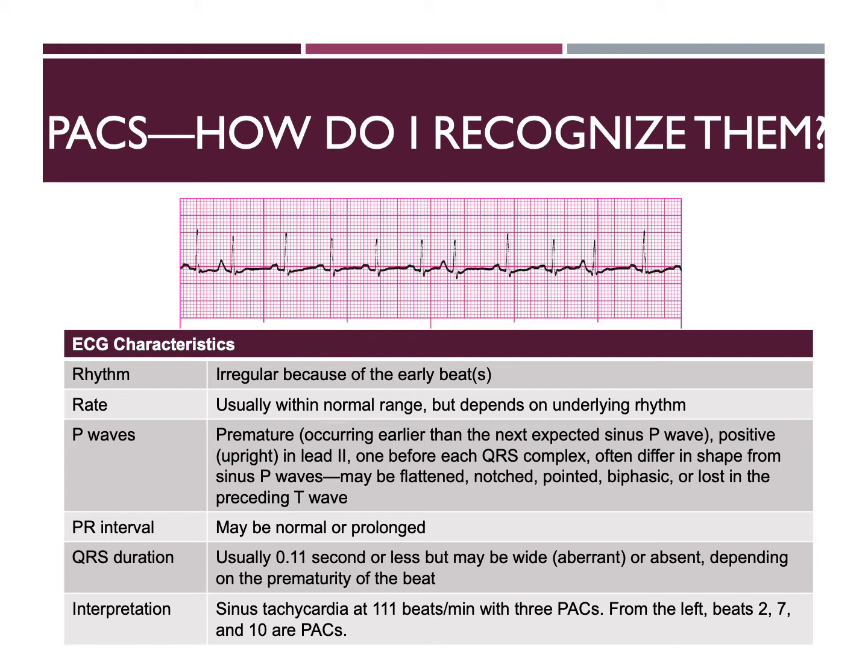As we follow along, we see normal beats in beats number 3, 4, 5, 6. But as we get to 7, see how there's a beat that's occurring much quicker than in the last few beats, and we also see another elevated P wave. Then we go back to a normal rhythm. And as we get over to beat number 10, we see another elevated P wave and a beat that occurs at a faster rate than the normal sinus rhythm within this strip.